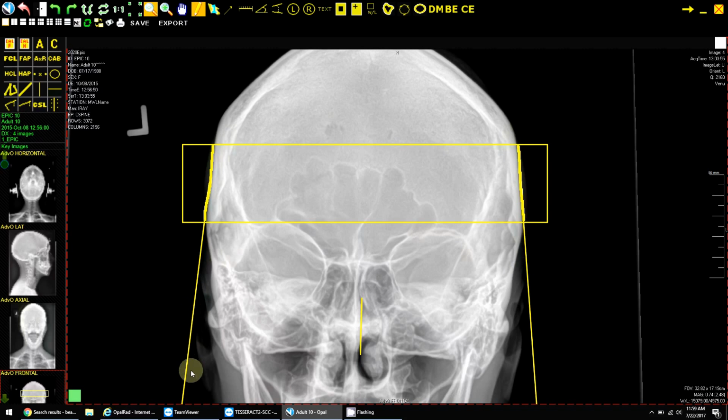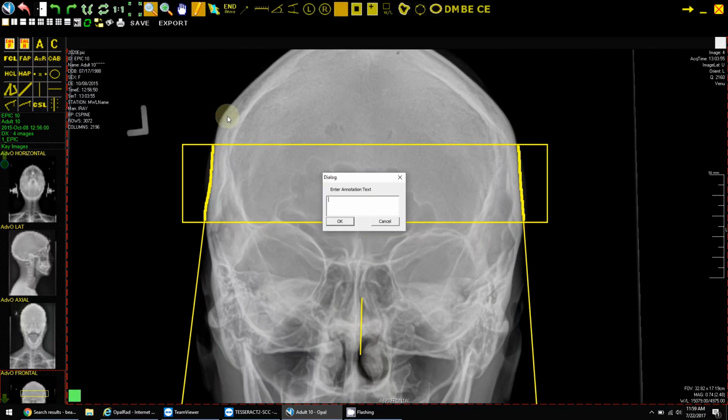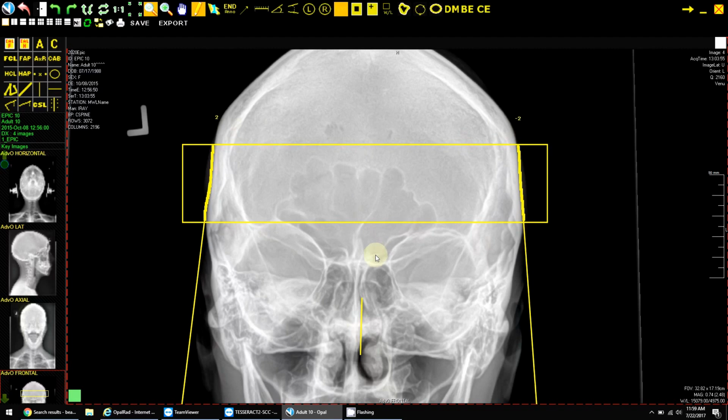It's taking this slope line minus this slope line, and that creates the difference. So let's say, I'll go ahead and type this in, if this was a slope of 2 and this was a slope of -2, when you add those together, that creates a slope of 0, and that would be a perfect central skull line, right? Where it just goes absolutely vertical, kind of like that. Obviously that's not the case for this patient, but it's just an example of what we're looking at.